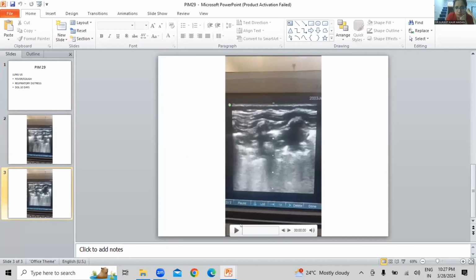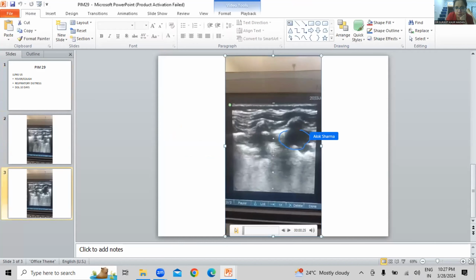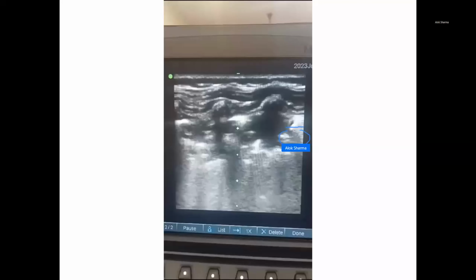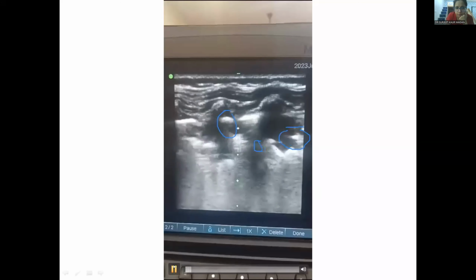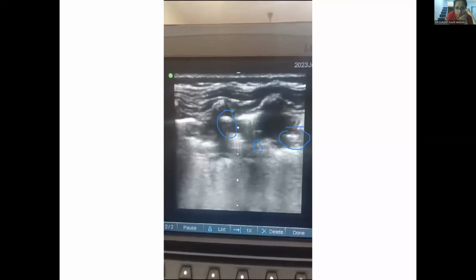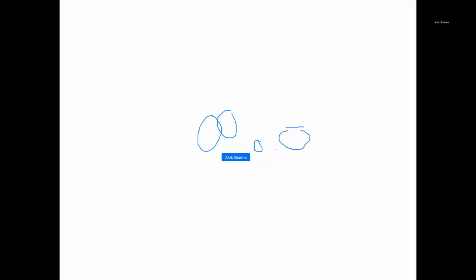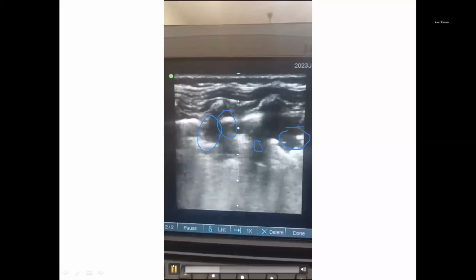This is another classical fractal sign. Pleura is destroyed, very irregular. These are small areas of subpleural consolidation that you see here. The question is whether that area moves in and out. Are you able to play it once more? Sorry, this area here, it appears and disappears, doesn't move in and out. So it's probably a static bronchogram. Yeah, it's easier to see now.